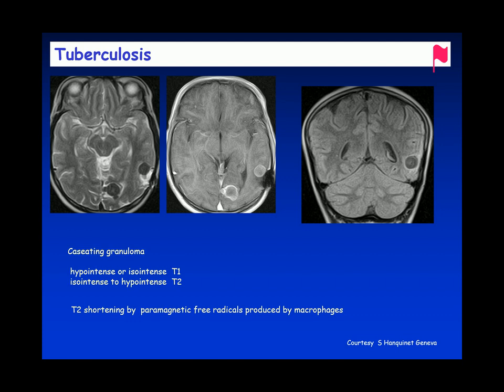Okay, so the low signal intensity on T2 is a T2 effect, but a T2 effect may be seen also if it is strong enough on T1 weighted images.